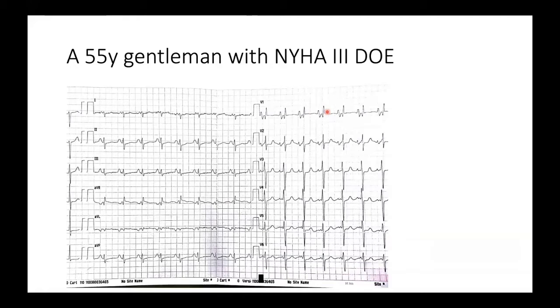So there is definitely a right ventricular hypertrophy and a right atrial enlargement. Now, apart from that, you can also see in lead V1 there is a negative terminal deflection, which suggests that there is a left atrial enlargement also. So this ECG suggests there is a biatrial enlargement.